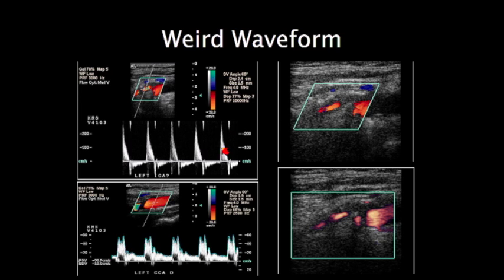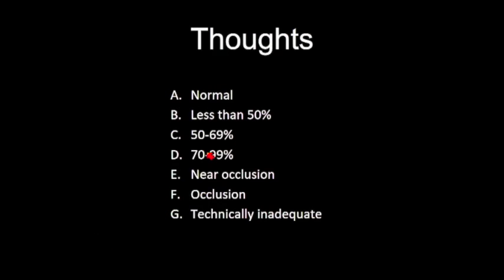I did want to point out the velocity here. That was some high number, 250 or even more. Okay. So does anybody want to commit to A, B, C, D, E, F? All right, let's do it this way. Any A's? Any B's? C, D, E, F.